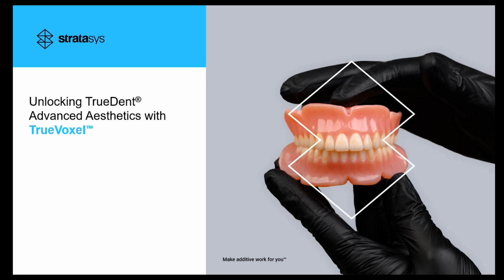We're really excited to introduce to you today these new features that will be coming to your GrabCAD on April 7th. The goal of today's meeting is to teach you how to utilize these software updates on your GrabCAD. And with that, we're going to go ahead and get started.